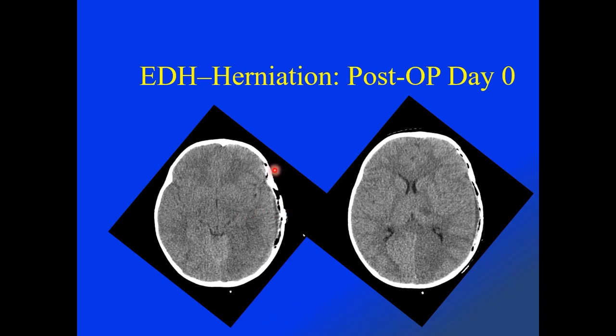Following decompression of the epidural hematoma, with only minimal residual postoperative air, hemorrhage and fluid collection along the lateral convexity, one now notes some areas of discrete hypodensity within the left thalamus, as well as developing hypodensity with loss of gray-white matter differentiation involving visualized left inferior paramedian parietal as well as superior paramedian occipital lobes.